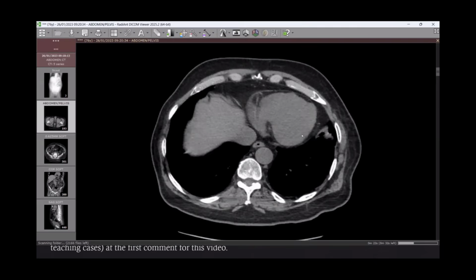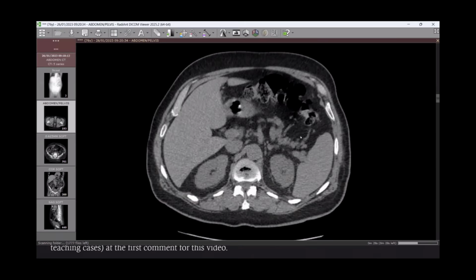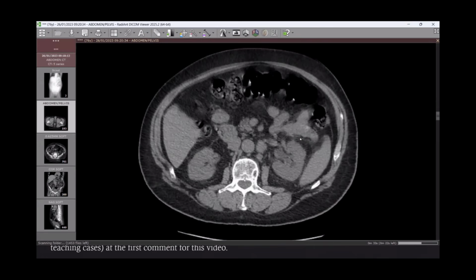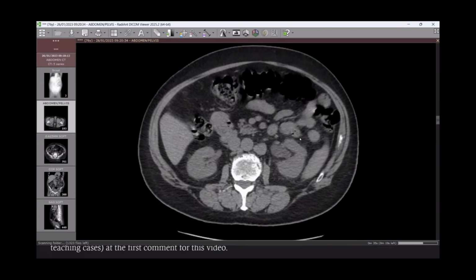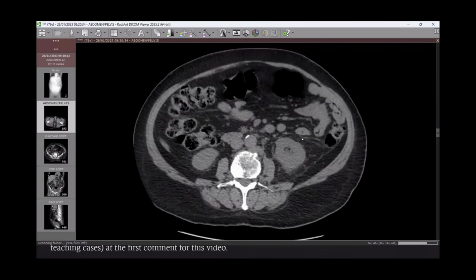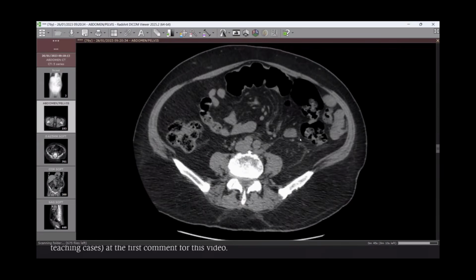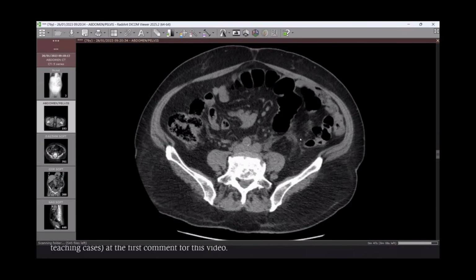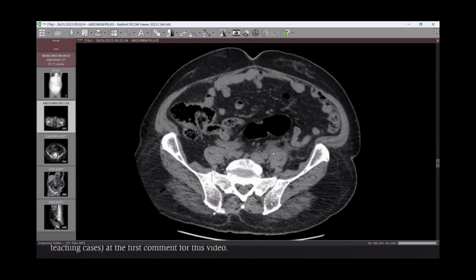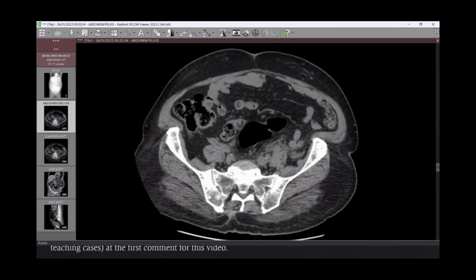So I'm presented with CT scan axial sections of the abdomen, unenhanced study. First, I would like to go through the stack of the images, then I will start describing my findings. I can see that there is prominence of the left ureter. The left ureter is dilated. I am tracing it downwards. I can see some soft tissue with calcific density on the left side.